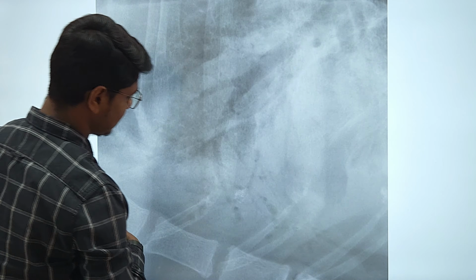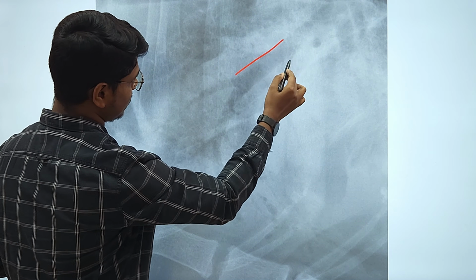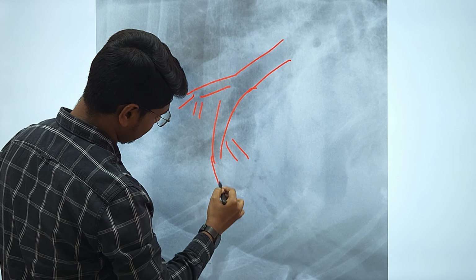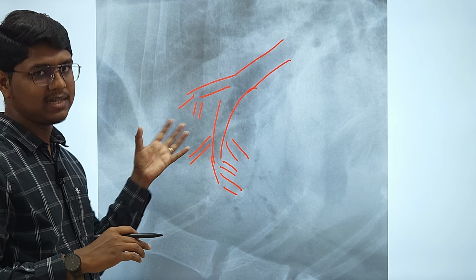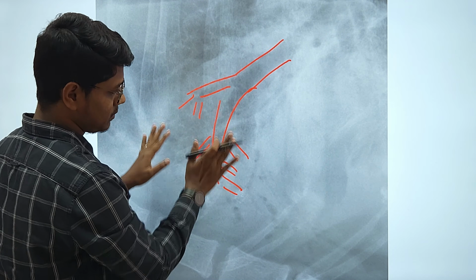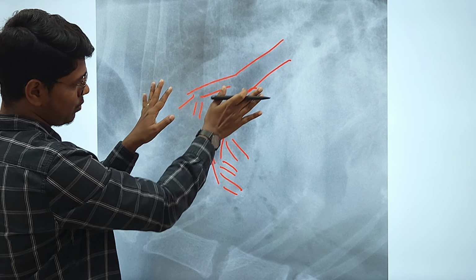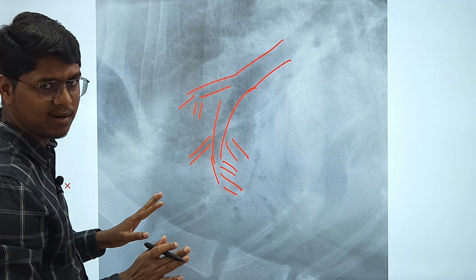Let us see another radiograph. Very nicely now you can see. This is the bronchus and here is the branching of bronchus. Like this it is coming, branching. Here is a branching, here is a branching. This is the bronchial tree. So this is the air bronchogram. The background is of soft tissue opacity because the alveoli is filled up with fluid, more or less likely cells. So now this background will provide the contrast for the normal bronchus to be seen, which is known as air bronchogram.